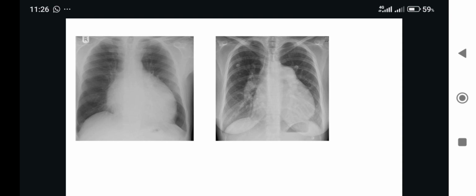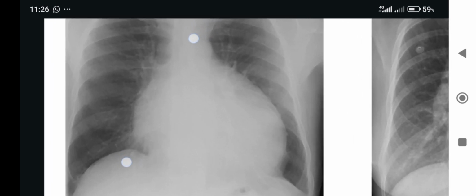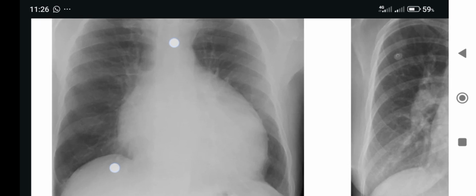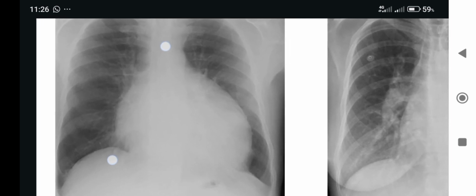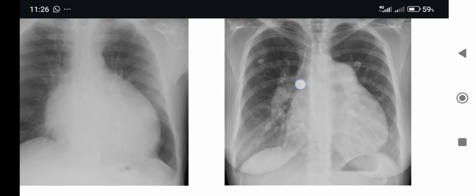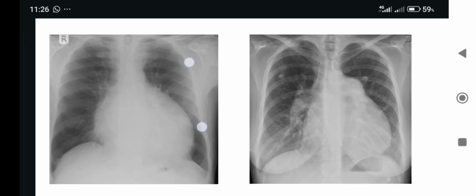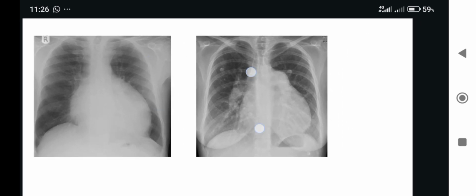Then you look at the comparison of pericardial effusion and cardiomegaly. The first image here is a case of pericardial effusion. You see there is a pulmonary oligemia. You cannot even appreciate the vessels. They are not prominent. The hilar is not prominent. But you look at the lungs. The lung field is clear. It's not crowded with vessels.